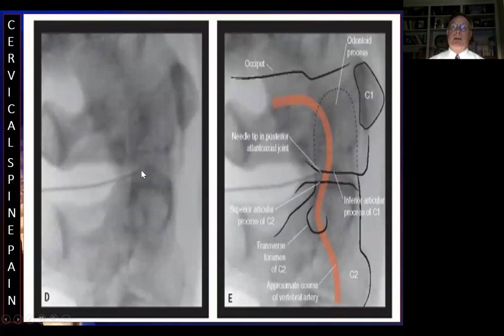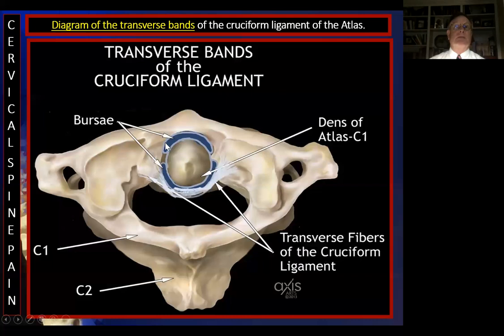We don't just go in with fluoroscopy and go, well, those two bones are there, let me stick that needle there. We use MR, we do CT, we do all kinds of cross-sectional imaging, ultrasound, to avoid these neurovascular structures. And again, like we talked about, here's the transverse band of the cruciform ligament on a short axis transverse view. Again, Rob Tribble's masterpieces, these are so beautiful. Remember, there's a bursa, or a capsulosynovial space. That's a capsular joint, just like your index finger, all your fingers are capsular joints.